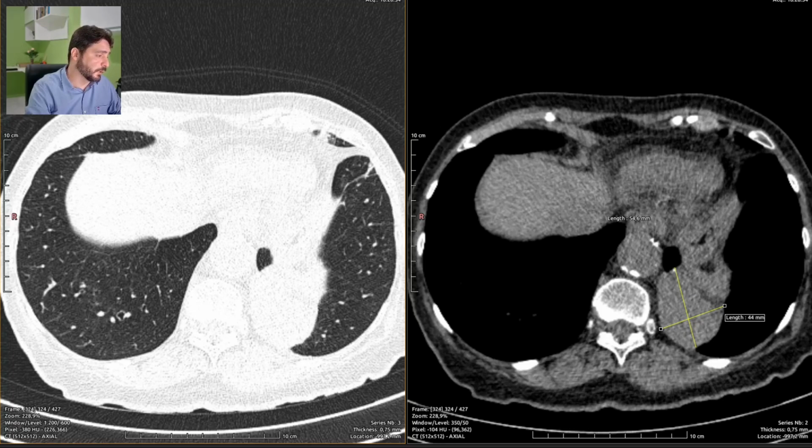Now I'm going to report the secondary lymph node enlargement. 1.3 centimeters on short axis. So let's summarize the report, make it easier to read. So I just summarize it as pulmonary masses on the left. Summarize it quite well. And we are done here. Let's just finish it, sign it, and move to the other exam.